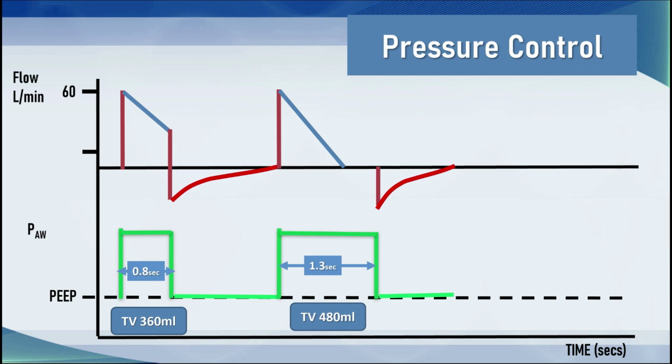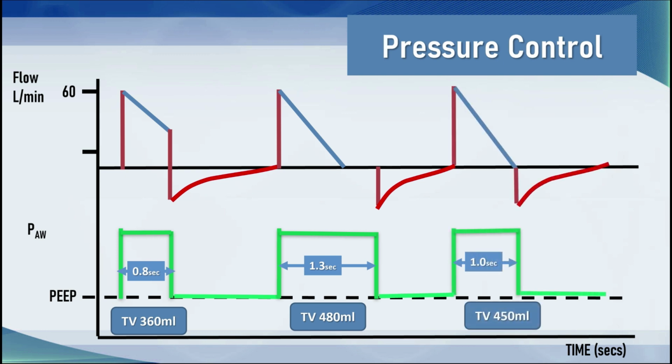However, we may not necessarily want the situation where there appears to be a significant inspiratory hold. Certainly, for hypoxic respiratory failure, this approach may be effective, but there is a risk, as we shall see, of expiratory dysynchrony. Briefly, what that means is that the patient may want to exhale before the end of inspiration that has been forced on them by a set inspiratory time. So let's pick a shorter time, in this case 1 second. And this looks good, right? The inspiratory flow goes down to baseline, followed immediately by expiration, and this mirrors normal breathing.